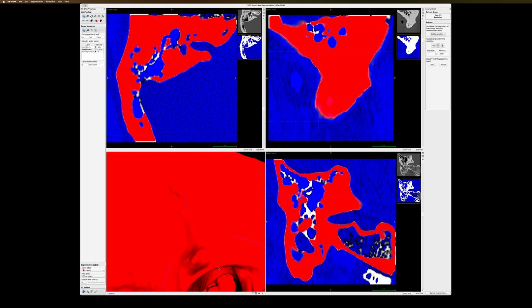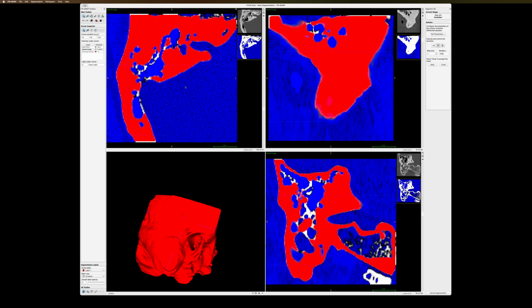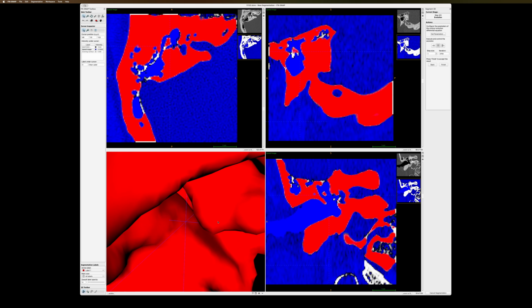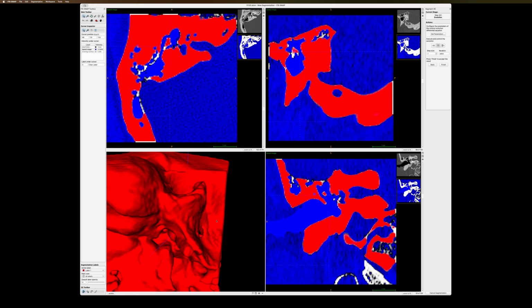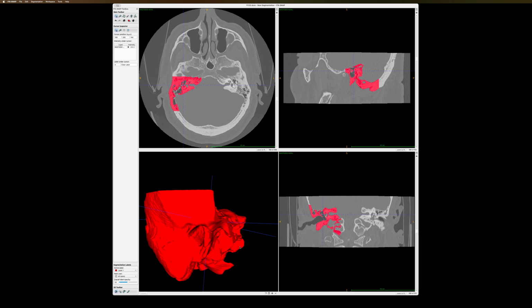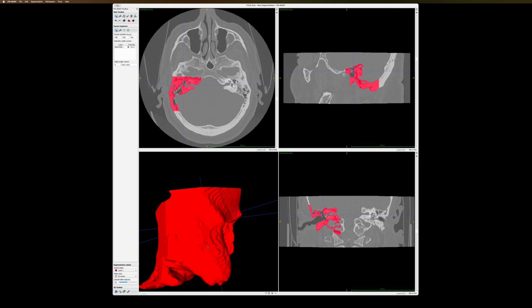But roughly, it looks pretty good. Again, I'm checking to see if we can see the ossicles, and they're not too good for now. So we'll have also to add them manually. So once we have this rough shape, I'm going to finish it. Update. Looks pretty decent. We're going to go and make it perfect.